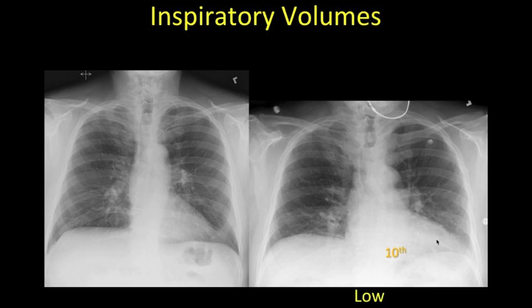We can see the crowding of the vasculature. You can see the heart that is accentuated by the low volumes, and the mediastinum in addition is something to be aware of as compared to an X-ray of more normal volumes.